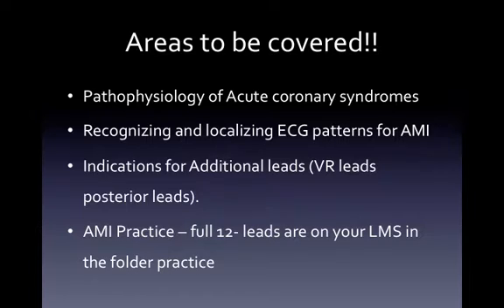AMI practice, acute myocardial infarction. We're going to look at some 12 leads here. There's 6 of them at the end. If you're wanting to print these off and do them along with the video, their full 12 leads are on your learning management system in the folder called Practice.